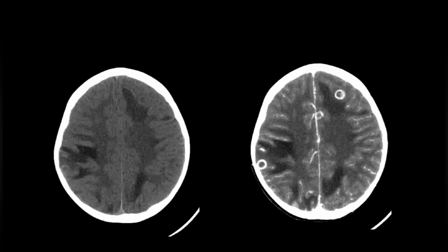There are other similarly enhancing lesions noted at the gray-white matter junction involving the anterior aspect of the left frontal region and the lateral aspect of the right parietal lobe. The lesion in the parietal region has significant perilesional edema associated with it. But there is no midline shift. I can also appreciate a few hypodense lesions involving the deep white matter in the left cerebral hemisphere as well. These are representing edematous changes.